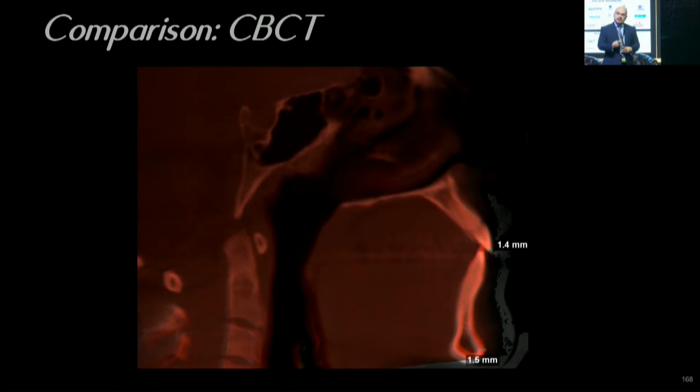So you can see the red is after, and the before is the white. You can see how the mandible changed a little bit in position, and this is how we corrected our class 2. And you can see here probably we got about 1.5 millimeters of intrusion, and with the auto-rotation we got a little bit of 1.5 millimeters of movement. It's very minimal, but it was ideal for that patient.